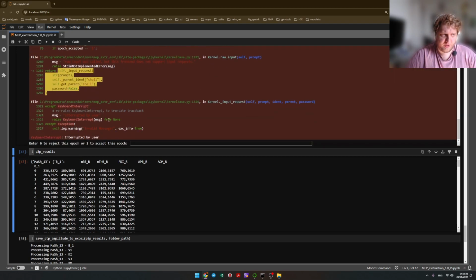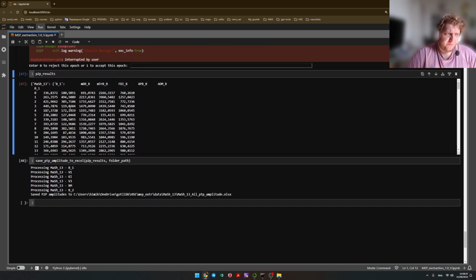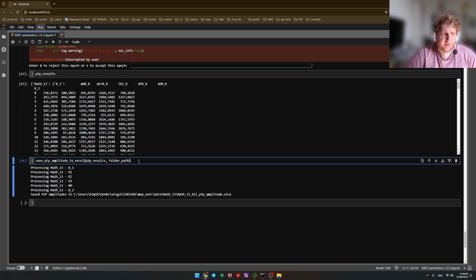I mean, not in this case, because obviously there is an error, because I stopped all the stuff. So these are our values. I compared these values with the Pavel script, and my script is quite precise, because our differences are only in 2 signs after the comma, so it's good precision in our case, because this is a data analysis and filtering process. It's hard and you don't need to understand. And then you run the final cell to save this.